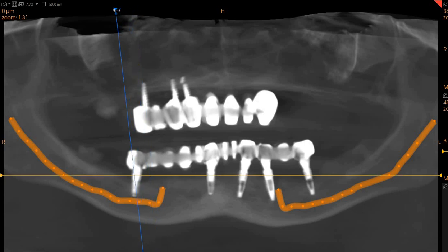This is the CBCT of the patient that you had requested. As you can see in this pseudo panoramic view, we've got the upper area of interest and we've got basal implants placed, which are three on the top right and no implants on the top left.